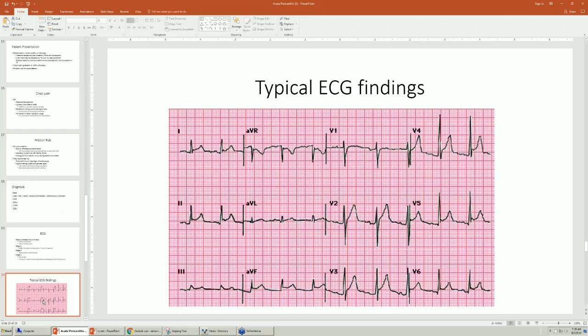But let's pop over here and look at a characteristic EKG. So here we go. We've got ST segment elevation sort of everywhere except aVR. And aVR, if you flipped it over, it would be ST segment elevation. Since aVR is looking from the opposite direction, it's going to be ST segment depression. And so you can see how prominent this is. And so this could look like early repolarization, but you usually don't see I and aVL like that. And so it's all lead systems. And time and time again, this has looked the same.